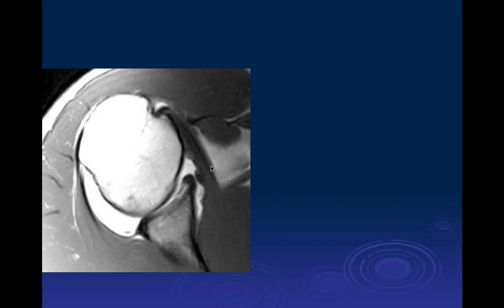Alrighty, so it looks like we've got another arthrogram. There's an axial image, and after that, at the anterior labrum, we're seeing this kind of linear signal abnormality working its way through. I'm not seeing any involvement of the underlying osseous structure on this cut. So it looks like we have signal going here. This is contrast going through a tear in the articular cartilage, undermining the articular cartilage and going into the anterior labrum. Also, if you notice here, we have a poorly developed posterior glenoid with some retroversion of the glenoid face.